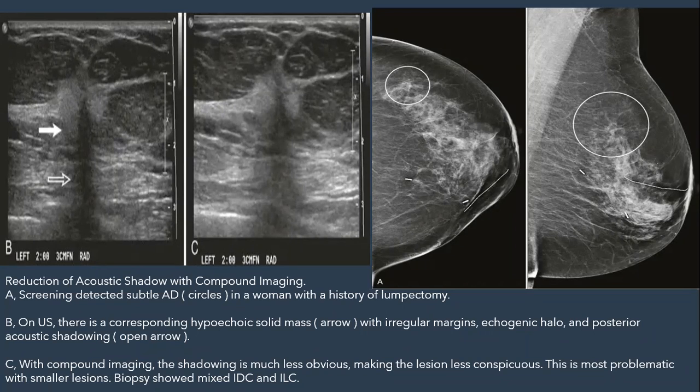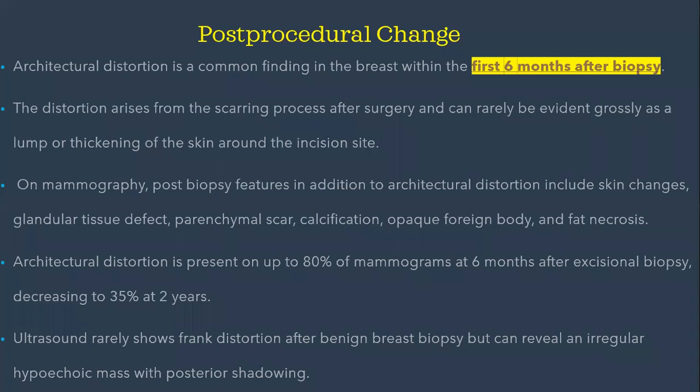And biopsy of this case revealed mixed invasive ductal and lobular cancer. Post-procedure changes can be seen within the first 6 months after biopsy, such as distortions and skin thickening.